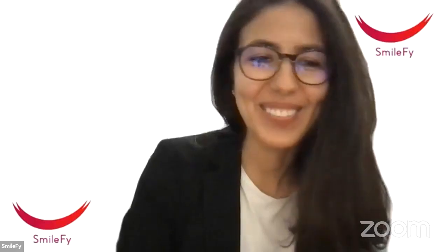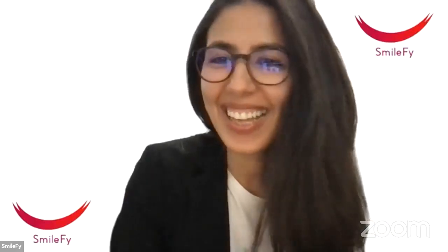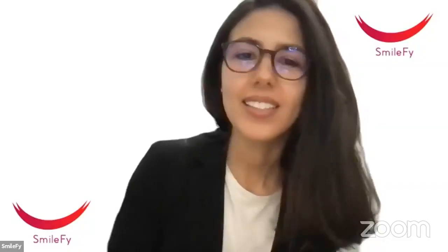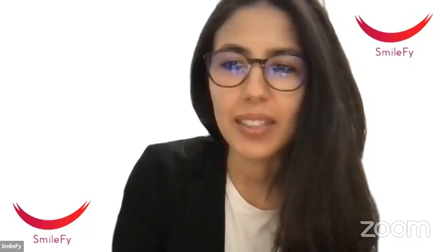So I'm going to give the stage now to Carmina. Are you there? I am. Okay. Hi everyone. So thank you for showing us the 3D design. For the doctors, I believe it's very helpful, so they can understand the workflow much better.